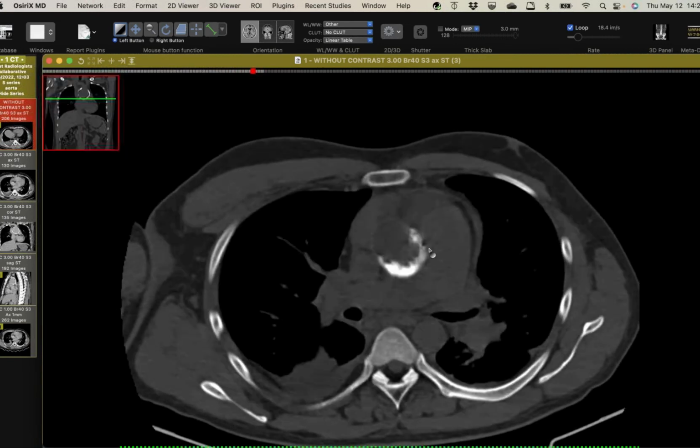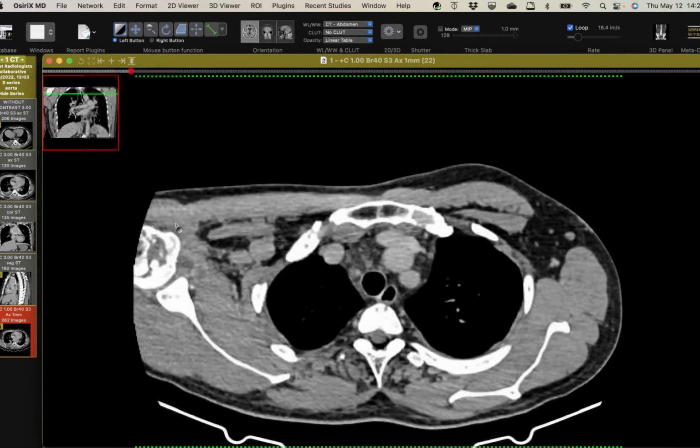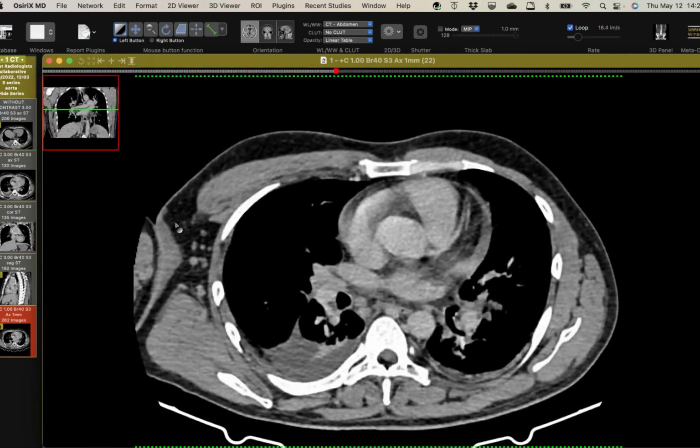Yeah, I like your diagnosis. How old was this patient? He was like 30 or something. He was young. I mean, he's male, so Takayasu's really isn't on the differential. And usually patients with that have a history of it, or they have other symptoms. This was incidentally picked up on a chest radiograph because they did a belly CT for belly pain. He had effusions, and so that's what prompted the chest CT, the abnormal radiograph. But given that, if you look at the rest of the vasculature, it's perfectly normal. There's not even a fleck of calcium.